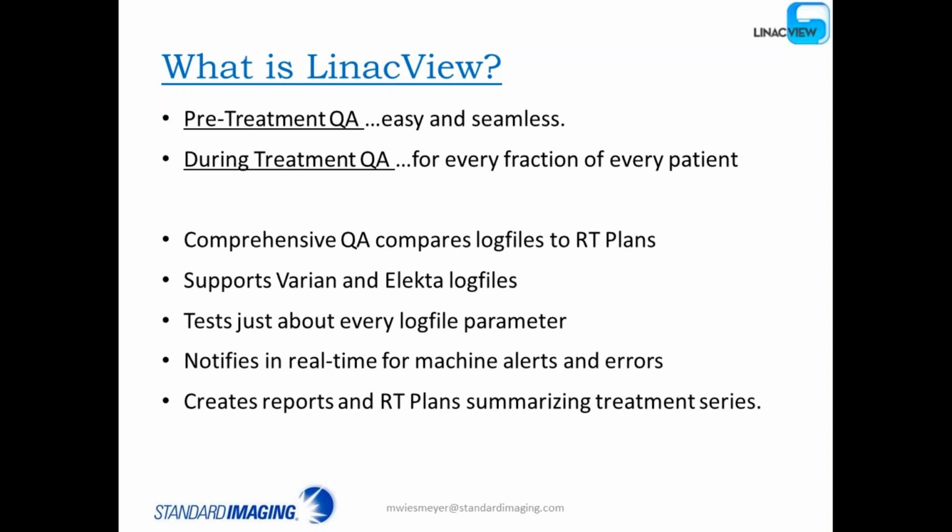It creates reports that summarize your delivery and your RT plan, and it also creates an RT plan that summarizes a treatment series. So for instance, if you have missing fractions or fractions that were not delivered completely, the system will keep track of that and create an RT plan that will account for the missing dose.